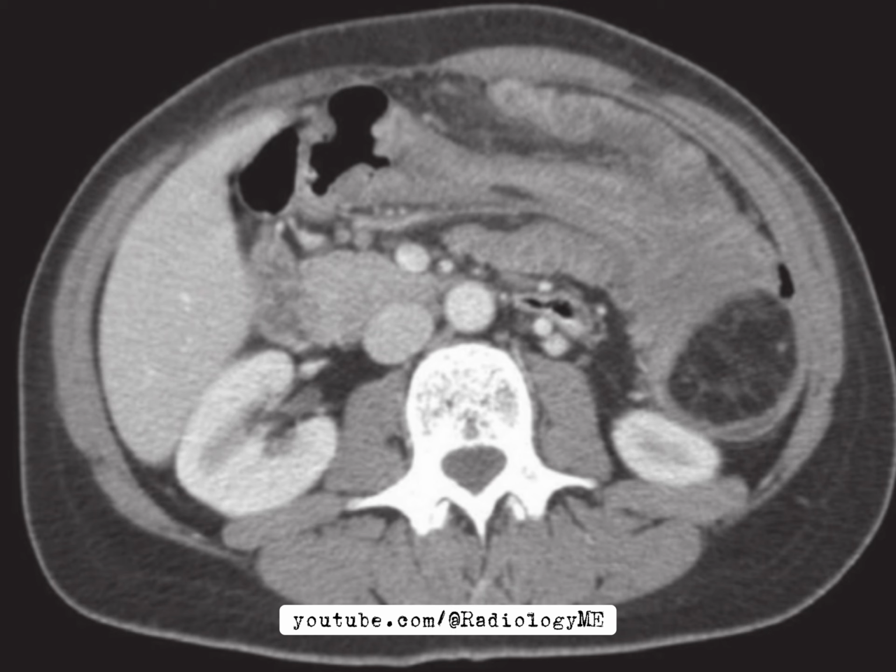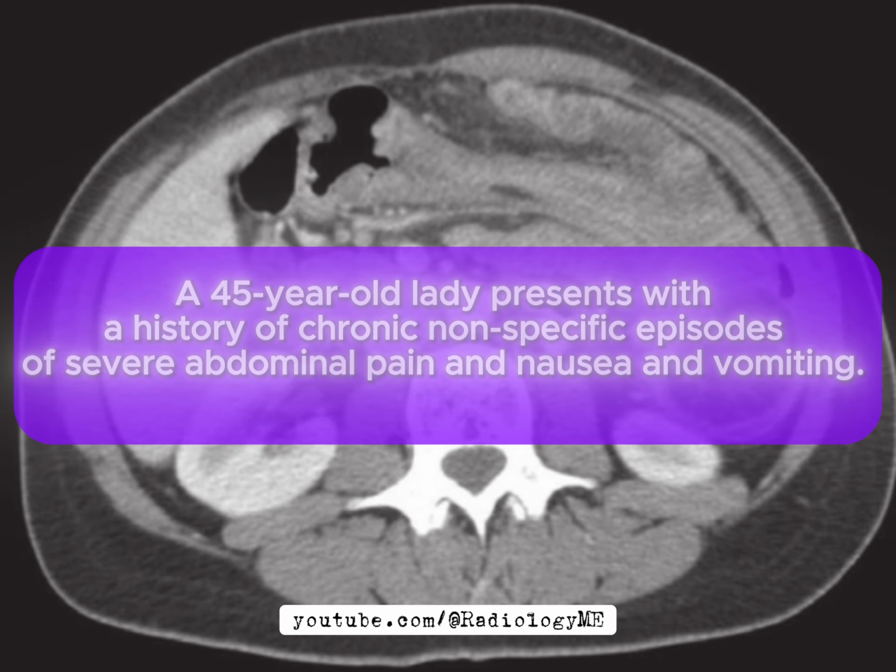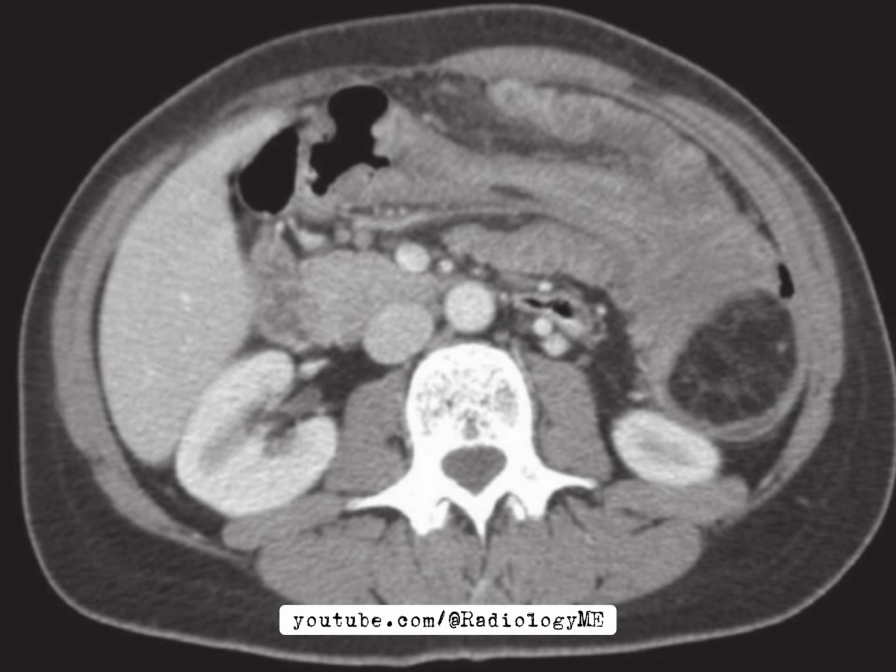So today we have an interesting case involving a 45-year-old lady who has been experiencing chronic, non-specific episodes of severe abdominal pain along with nausea and vomiting. Interestingly, her plain radiographs, ultrasound, barium studies, and even endoscopy have all been reported as normal. It's definitely one of those cases where we know something more is going on, so we turn to cross-sectional imaging, specifically a CT scan of the abdomen and pelvis with both intravenous and oral contrast.